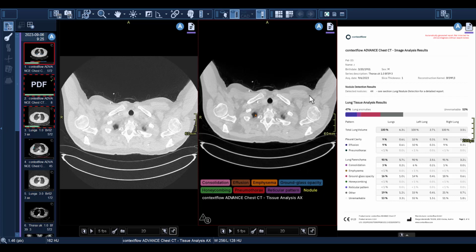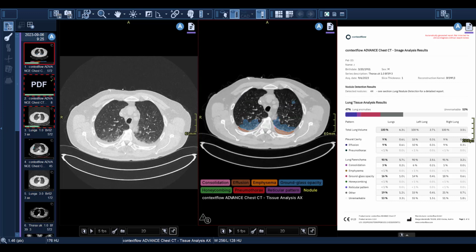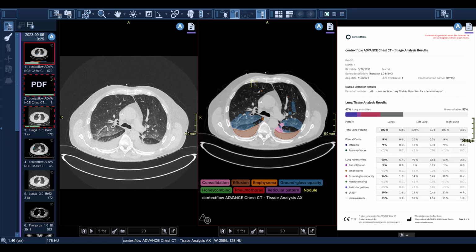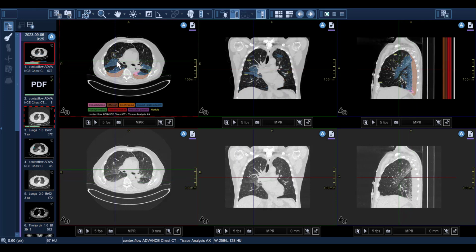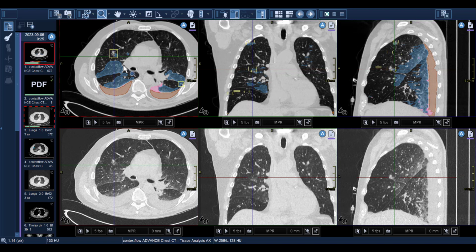Via specific automatic hanging protocols in the PACS, you are able to review linked results like this, with the 1 mm chest on the left side and the analyzed secondary capture series with the finding overlays and the label result in the middle. Nodules are marked with a yellow square. With a customizable easy shortcut in PACS, you can make this MPR review and scroll through in all three axes and zoom in to have a closer look.